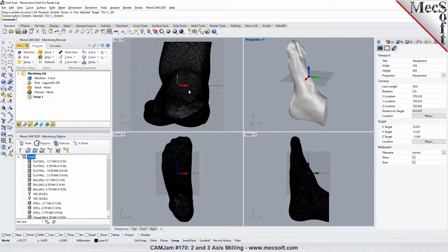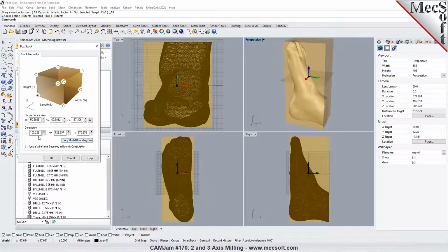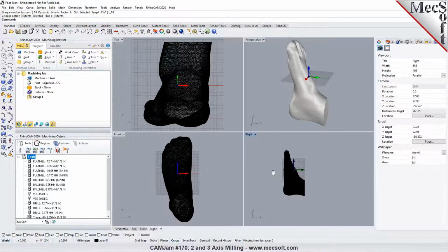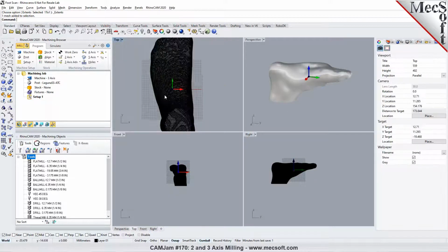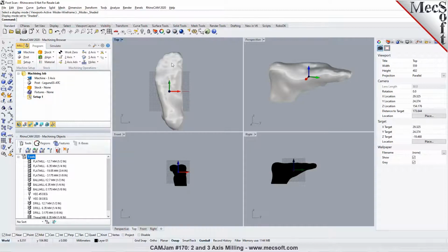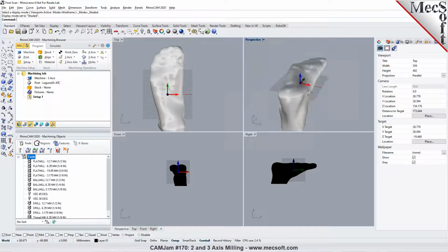So I got this part loaded in here. So let's go ahead and take a look at the dimensions. Okay, so that seems to be okay if it's in millimeters. Okay, I just wanted to make sure that it wasn't too big. So now, typically I would do a rotation of this part to line it up the way I want it. So I can use this gumball here to rotate it. I could say rotate it minus 90 degrees, right? So now if you look at it from the top view, it looks the direction you want to machine the part from, right? Right.